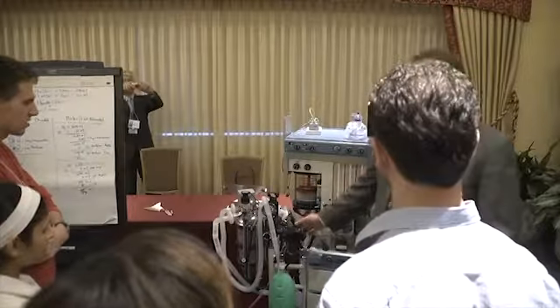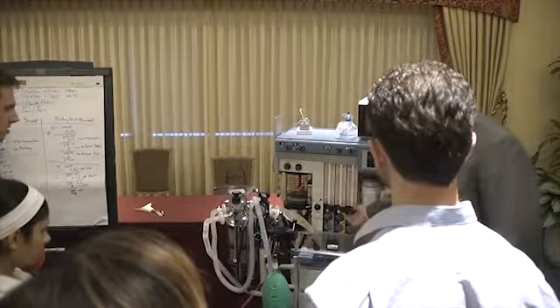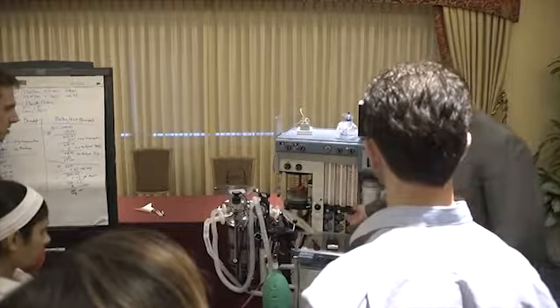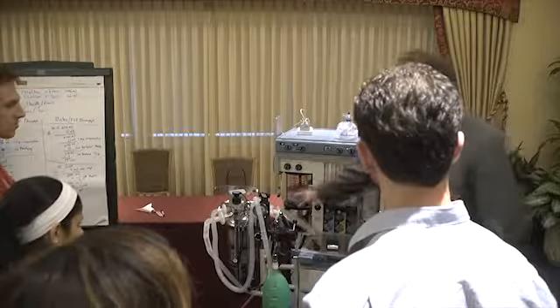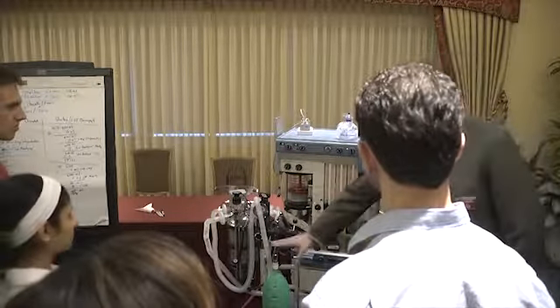With the 1 liter gas flow, I can look up and see what my tidal volume is. Now, this machine does not compensate for compliance, and it doesn't compensate for fresh gas flow. So as I turn this up to, let's say, 8 liters of flow, which is typical of an induction, you're going to give them 8 liters of flow, pre-oxygenate, and you can see that my tidal volume is significantly higher than what I would maybe have expected to see here. Okay, so this is out of the circuit. Our fresh gas obviously affects tidal volume, and that's what we're trying to show here.